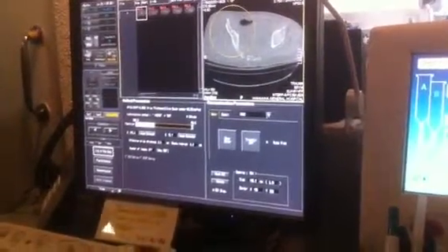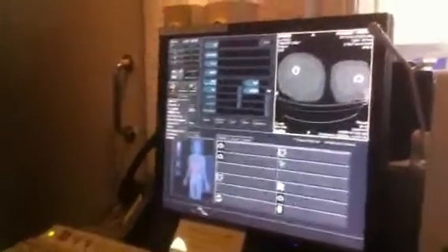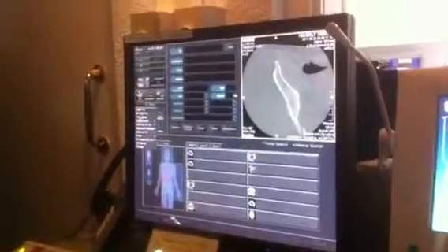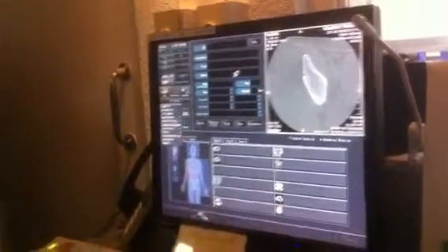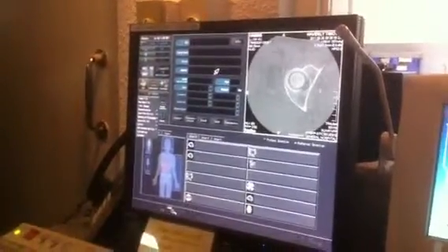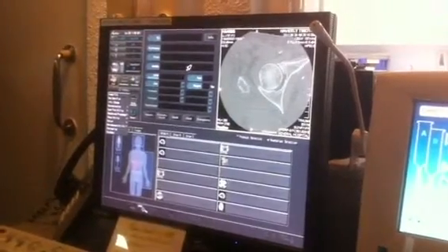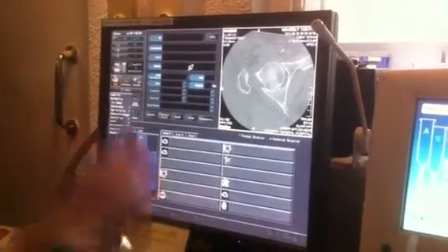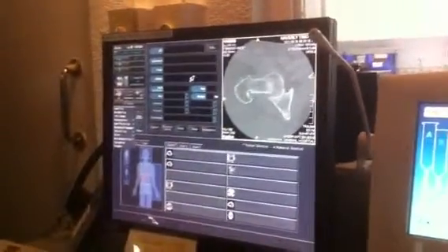So the workaround basically is: number 1, info change to split it off, split the raw data. Number 2, once it's already split, you want to make some reference images so you have something to work with. Then you're going to quit raw data because it doesn't update on its own. Then go back into raw data, get that same exam, and then you'll be able to do anything on it.